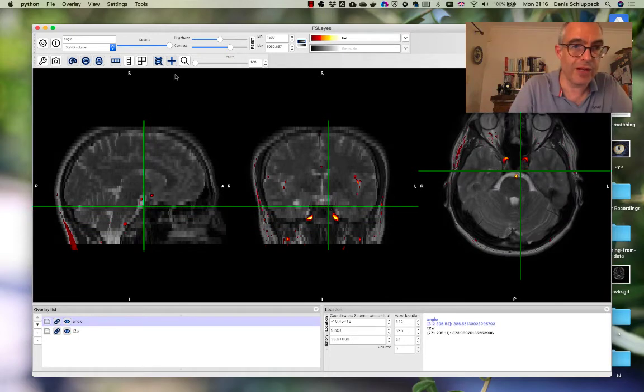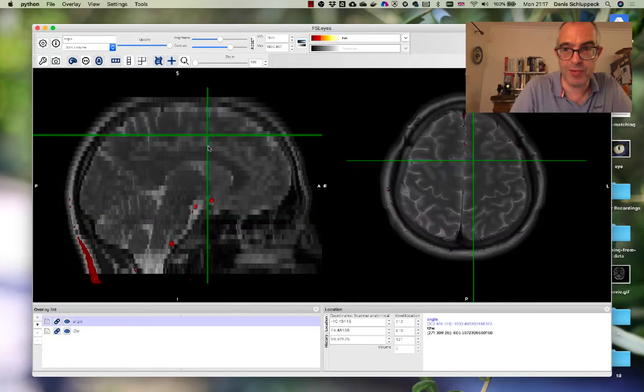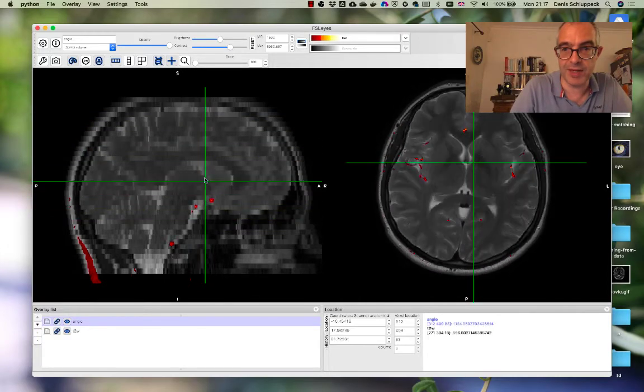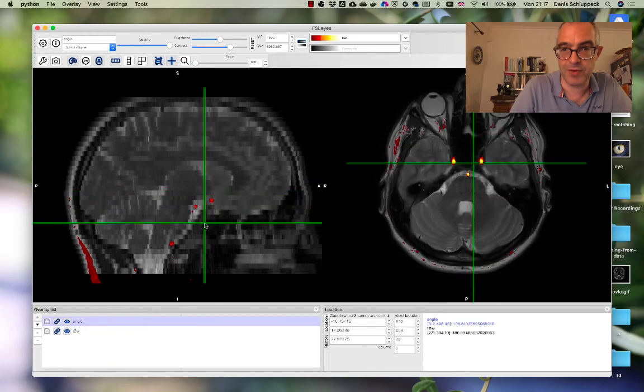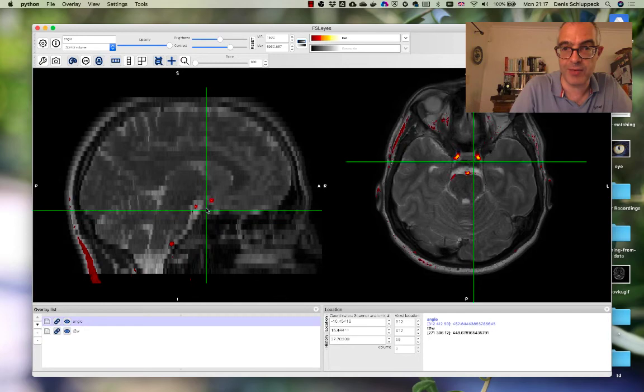And so one really cool way to look at that is to go through the slices. So let me switch this particular view off. There's a movie mode as well, where you can scrub through the images this way and record an animated GIF of what's going on. Okay, so this is one way in which you can start interacting with the data. So that's already the first bit.